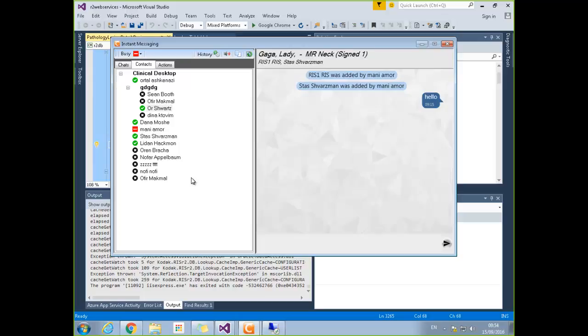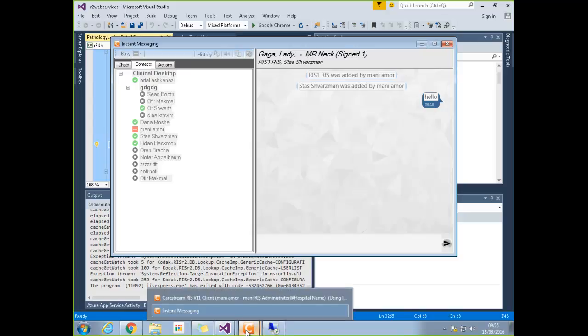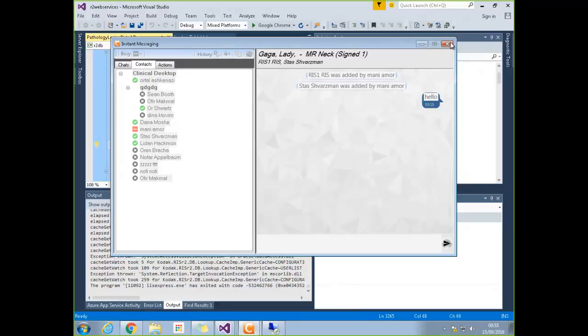So go offline if you don't want me to contact you in Notes. You see it immediately. You can add a button about the status when you search and find, so you can add that. But I had to type the name of the person. Yeah, I agree, you need to create that list manually.